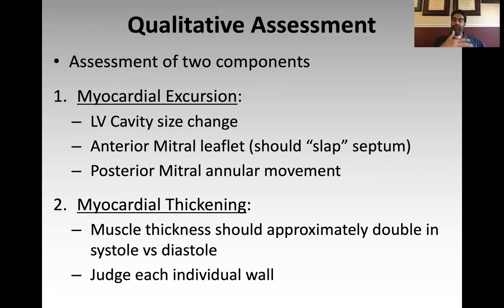Okay? And what that suggests is that the atrioventricular pressure gradient is high, making the flow through the atrium to the ventricle great, pushing the mitral valve up against the septum. All right, and the reason the pressure gradient between left atrium and left ventricle is high is because the left ventricle emptied very effectively before diastole.